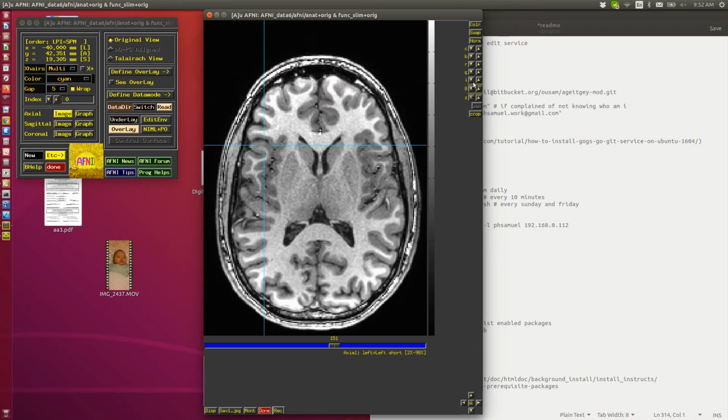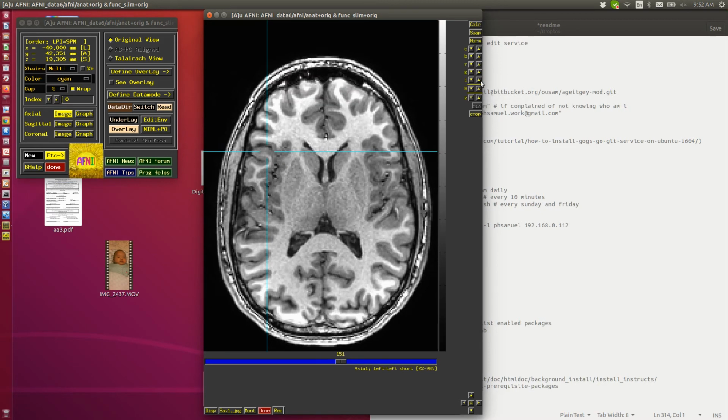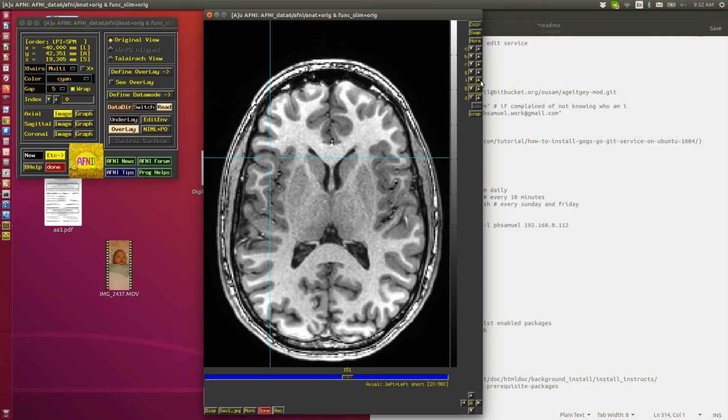Don't be afraid of the graphical interface. My wife is an incredibly intelligent woman. She's definitely afraid of graphical interfaces. I'm not going to click on that button until you tell me what it does.